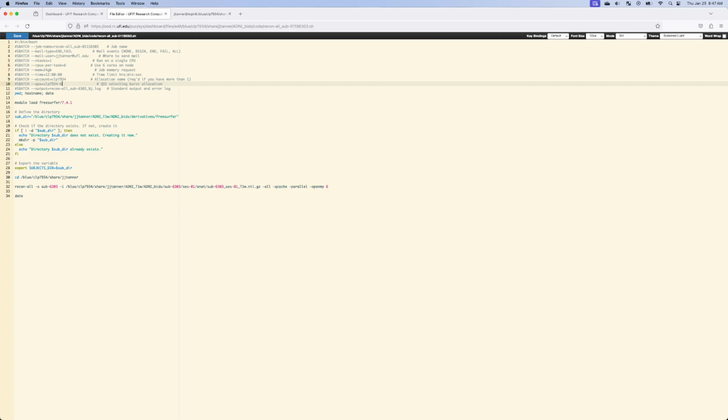But if all of you wanted to run this at the same time, and we're requesting 6 cores, that wouldn't work. And so what we're going to do is request burst allocation, and this is going to push this processing a little bit at a lower priority for HyperGator. But if there are available cores, then it will run it, and then it's running and it'll complete.